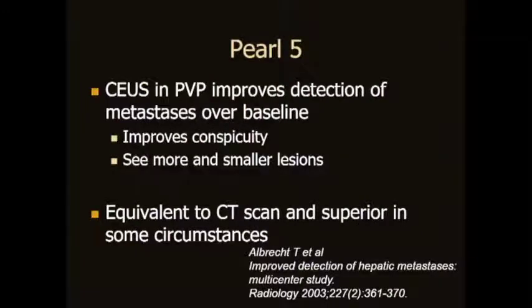Now, pearl number 5 and pearl number 6 are related to each other. So contrast-enhanced ultrasound in the portal venous phase obviously will improve the detection of metastases over baseline, in that it improves the conspicuity of the lesions, and therefore we will see both more and smaller lesions on CEUS than we will see on baseline ultrasound.